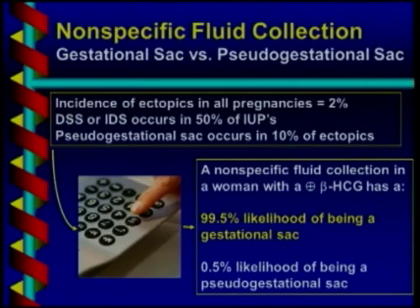So those nonspecific fluid collections, like I showed you on the prior slide, are over 99% likely to be a gestational sac.